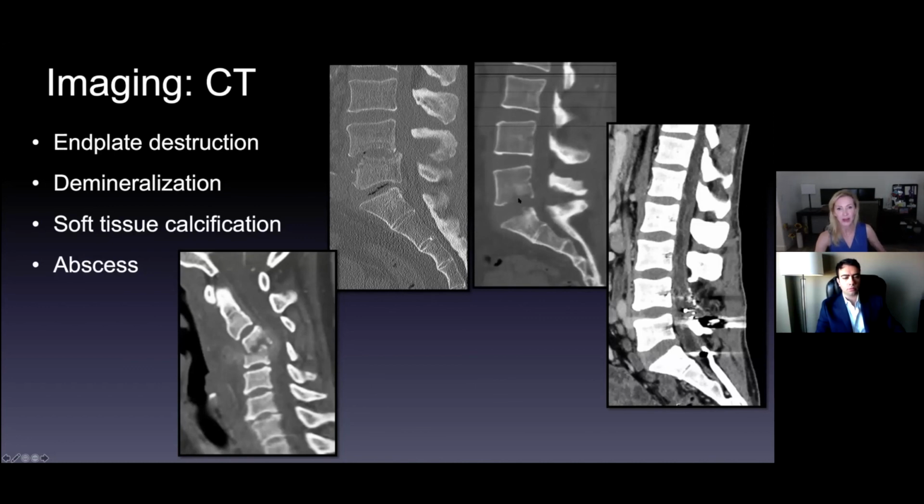We've lost it right here. That's infection eating underneath this vertebral body. Two things can make it look like this: degenerative disease or infection. Now, degenerative disease, this is not a typical picture really. And it doesn't have this kind of, we call it moth-eaten in radiology. It's like it's permeative. The bugs are eating it away.